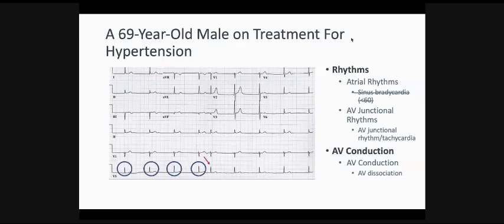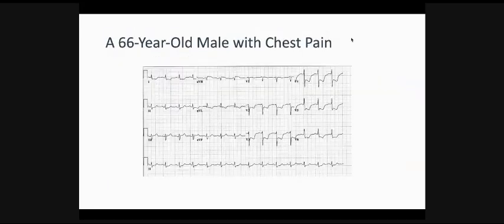Okay. Now let's go over this 66-year-old gentleman with chest pain and see if you can code this right or not. Again, let's take 30 seconds to see, and this should be easy as well, but it has a take-home message.